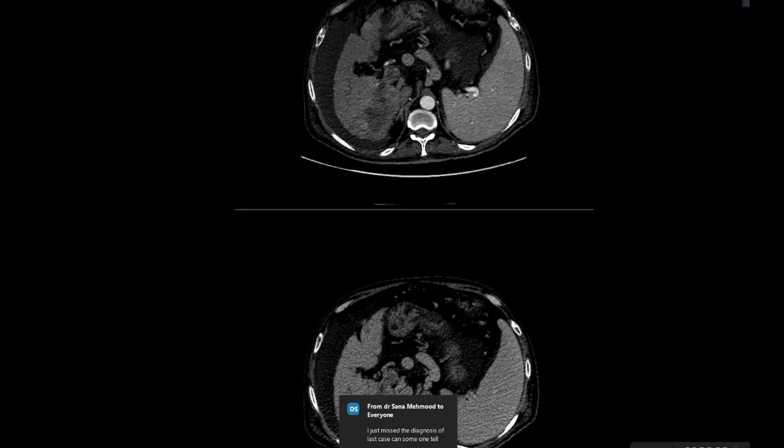If the examiner tells you to summarize your finding, don't repeat your finding as the same. So I will say cirrhotic liver with hypervascular lesions. Sorry, sir, I'm unable to understand. In summary, we're dealing with cirrhotic liver with hypervascular lesions.